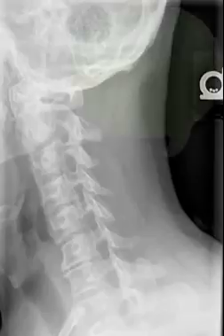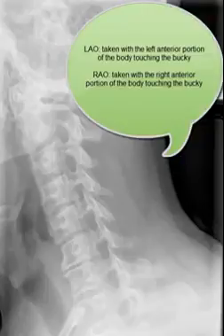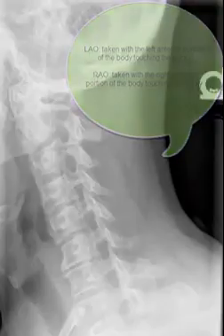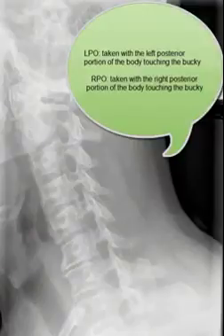So, for example, if we take a left anterior oblique radiograph of the cervical spine, that implies that the left side of the patient, as well as the anterior portion of the left side of the patient, was positioned up against the bucky. This will become important in testing situations or in written examinations when asked questions like: an LPO projection of the cervical spine was obtained, and which IVFs are you viewing?